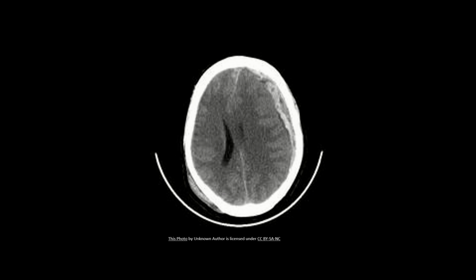What I wanted you to see right here is the falx cerebri, the white structure here. Let me remove that so you can visualize it. It was supposed to be straight like this, but it's gone kinked. Let me remove that again. Right, so this is in response to a subdural hematoma to the left. We will definitely deal with this later on. Just wanted you to see the falx.